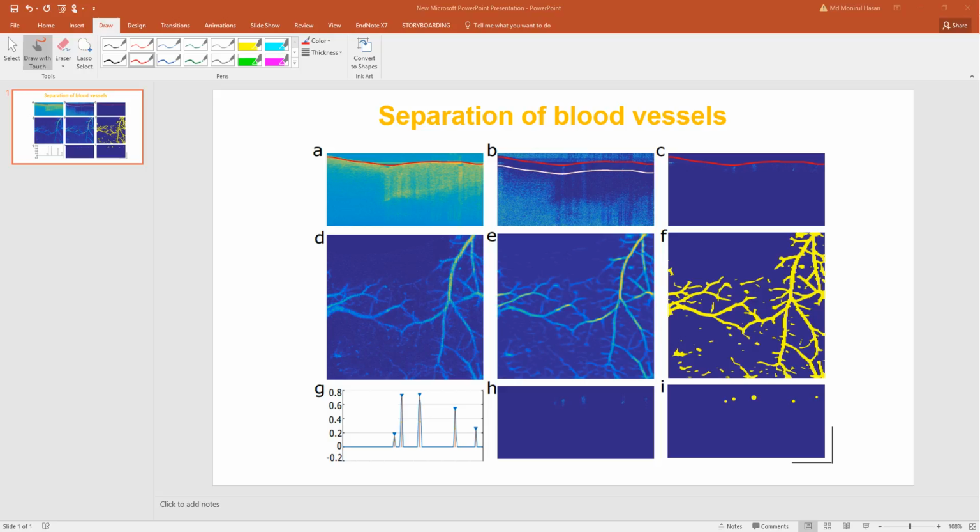In stage 3, our input will be image C and image D, that is the SNR threshold flow image as well as the cleaned cross-sectional, clean unfuzzy image. And we will go all the way, but there is a long step, so I will separate stage 3 into two parts.